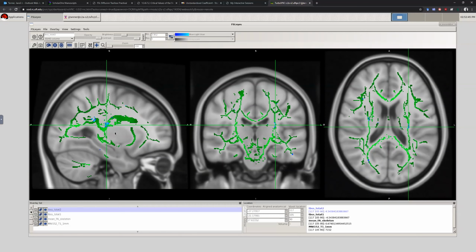These particular data are a little bit contrived, meaning that what I'm calling the control group just happens to be one group of adults, and the patient group is another group of adults, and they are different groups, but what I was calling control and patient was actually arbitrary.